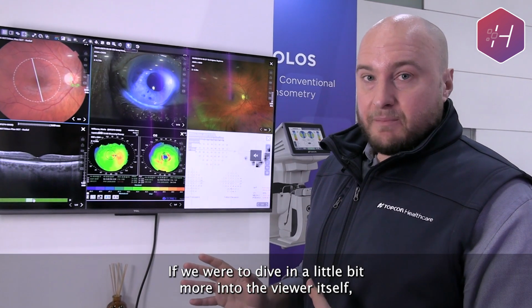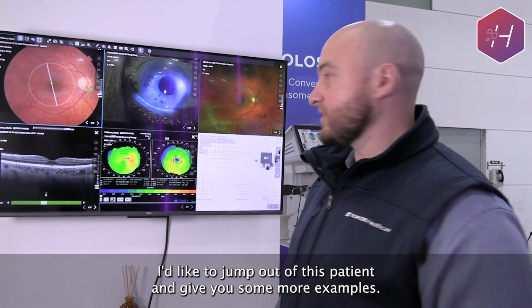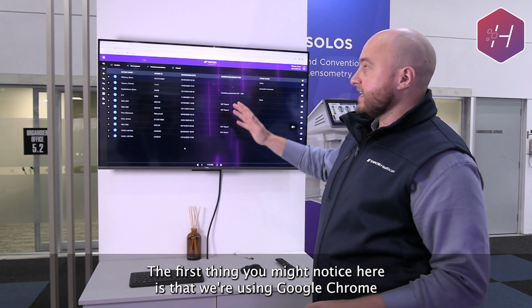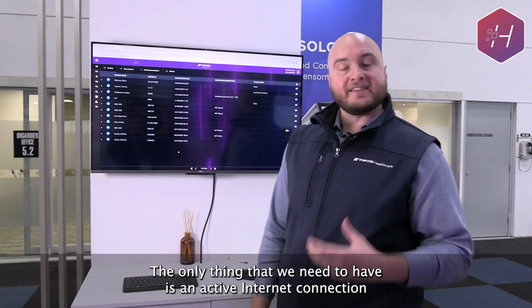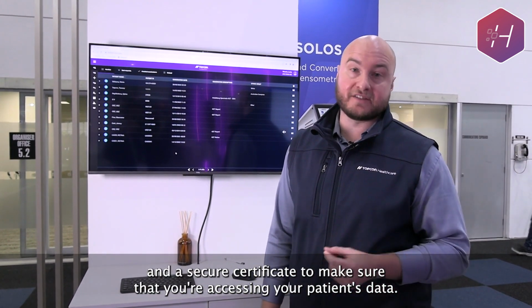If we were to dive in a little bit more into the viewer itself, I'd like to jump out of this patient and give you some more examples. So let's take a bit of a backward step. The first thing you might notice here is that we're using Google Chrome, or really any internet browser. The only thing that we need to have is an active internet connection and a secure certificate to make sure that you're accessing your patient's data securely.